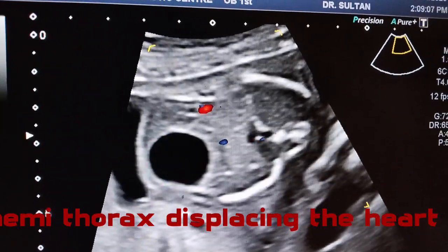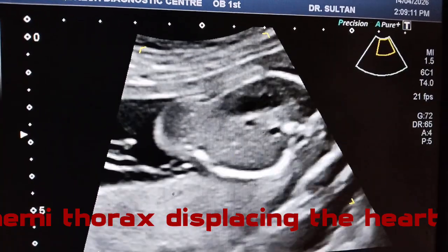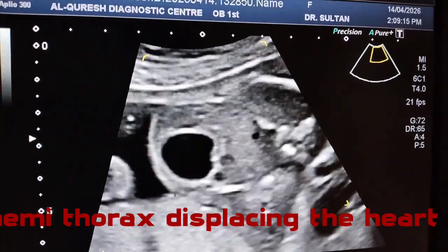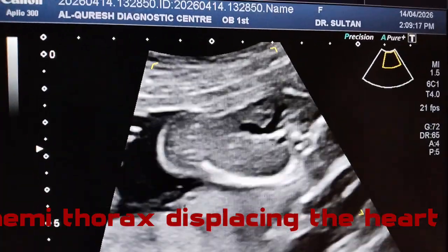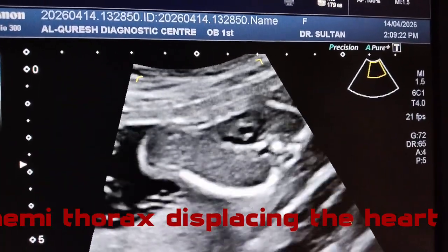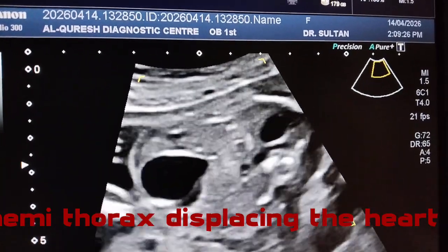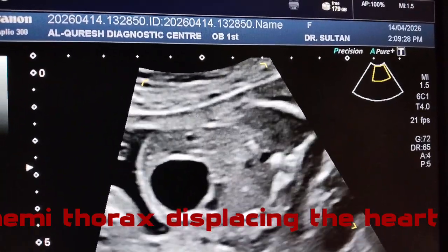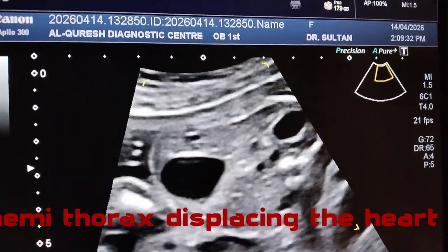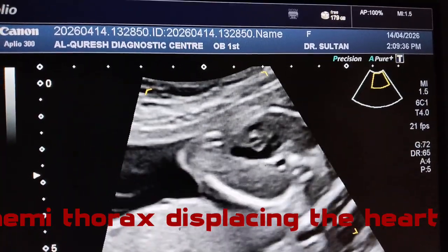So in my opinion, this is the classical case of duodenal atresia with double bubble sign, and also another anomaly is the right-sided congenital diaphragmatic hernia, through which the liver has herniated into the thorax, displacing the fetal heart toward the left.